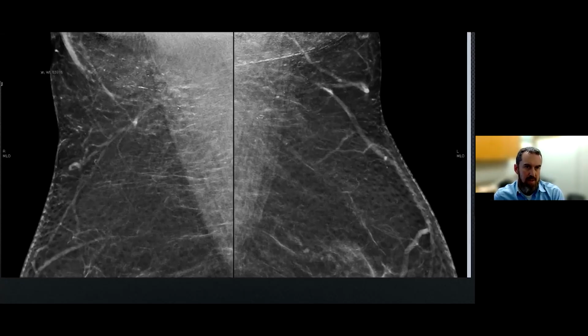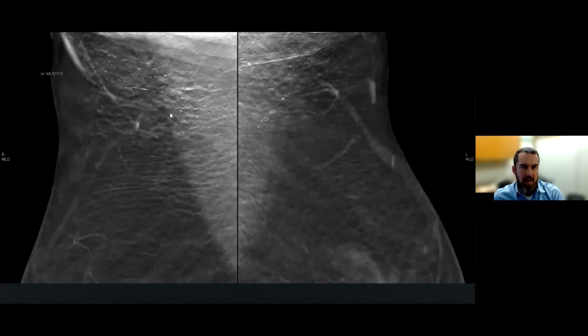Similarly, in this case, we see some calcified material at the superior aspect of both breasts and the axillary regions, and this is compatible with deodorant artifact on the skin. And we can prove that by seeing that that material is demonstrated in the skin on DBT slices.